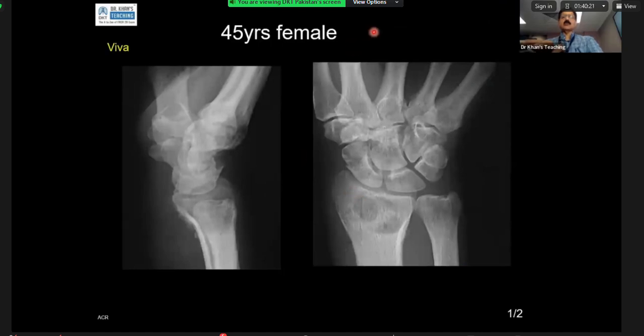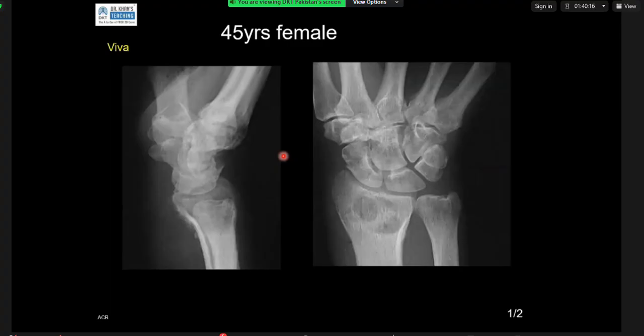Provided frontal and lateral projection of the wrist with proximal hand showing an ill-defined lytic lesion involving the epiphysis of the distal radius with a wide zone of transition and a thin rim of sclerotic margin. There is also an associated cortical break along the lateral cortex.